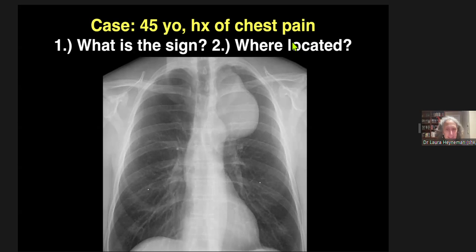And then I'll do this case and then pause. So here's a patient. They have a homogeneous opacity with a broad abutment against the mediastinum and a pushing margin, very well-defined margin against the lung. So that suggests to me that they have a mediastinal mass.